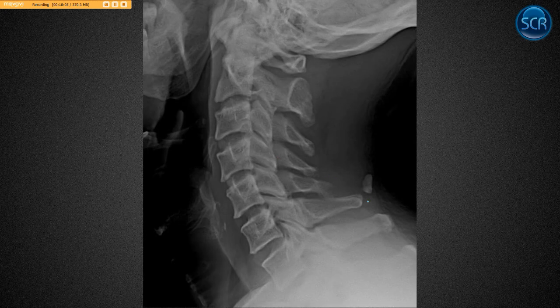All right. What am I trying to show in this case? Got a nuchal bone back here. Some tiny little osteophytes, no big deal. Disc spaces look relatively good. ADI is normal. Everything's lining up here pretty nicely. So this is just a normal variant sesamoid bone. No one cares.